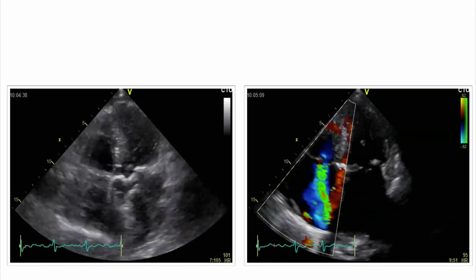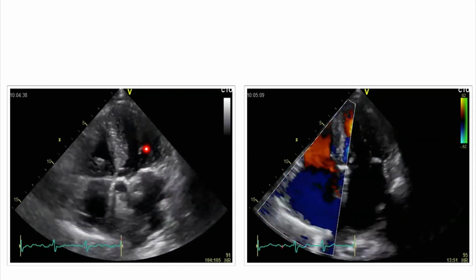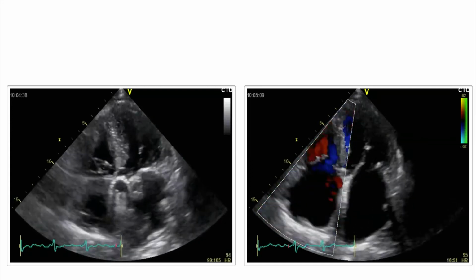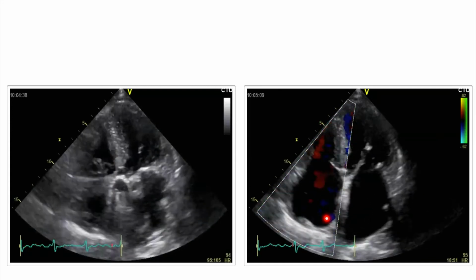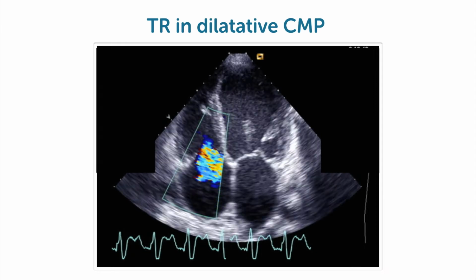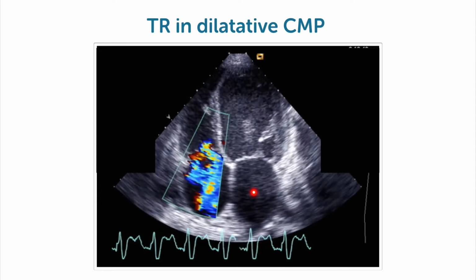And here we also have a left heart problem, a patient with aortic stenosis, probably with diastolic dysfunction, also pulmonary hypertension, and then eventually also tricuspid regurgitation, which I think you will agree is maybe moderate. And finally, very frequently we will see it in patients who have left ventricular dysfunction. This is a patient with dilated cardiomyopathy, poor left ventricular function, and a dilated left atrium.